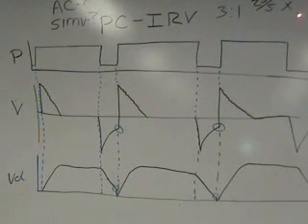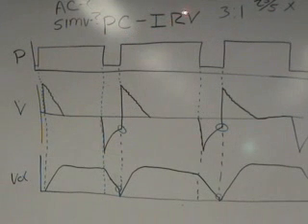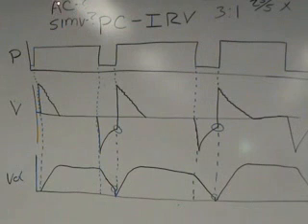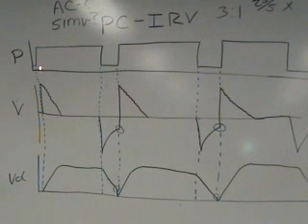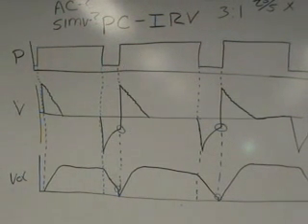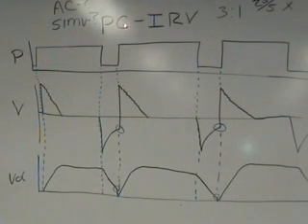All right, so here I have an example of pressure-controlled ventilation inverse ratio. It doesn't matter if you're in assist control or SIMV. So you can do PC, AC, or PC, SIMV, because the fact of the matter is the patient is paralyzed, and therefore he's not going to trigger anyways. So if you take a look at this, it's just like PC, AC without any patient triggers.